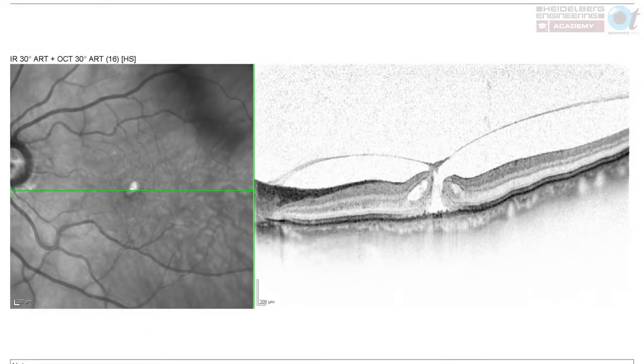The observant of you will notice this very small, solid dome-shaped hyperreflective lesion just beneath the retina. And that's probably adult vitelliform dystrophy, but it's just an incidental finding. But look at the left eye. That demonstrates a full thickness retinal defect with interruption of the inner segment outer segment junction line. So the photoreceptors are missing. Furthermore, there's perifoveal vitreous separation with persistent adherence of the vitreous to the foveal retina, leading to traction of the foveal retina and resulting in this hole formation. And because it's a small hole, they've got a favourable prognosis and will benefit from surgery.